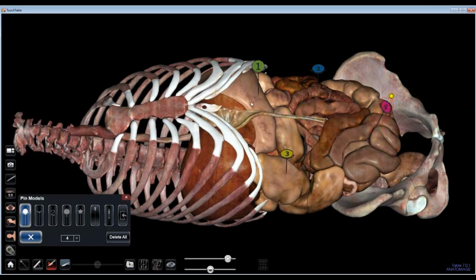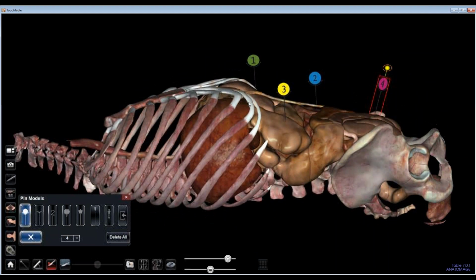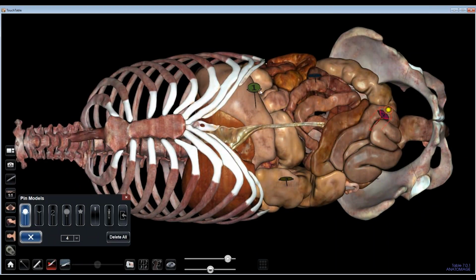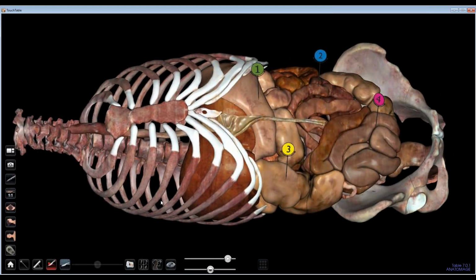So for example, if you were creating this on the table and your students are interacting with it on the table, maybe not a big deal how the pin sits because we can rotate and interact with it. But if you're taking screenshots, then we'd want to open these faces up just a little bit so students can actually see on the screenshot. Now we can create numbered quizzes, presets, images, etc. Great way to create a homework assignment.